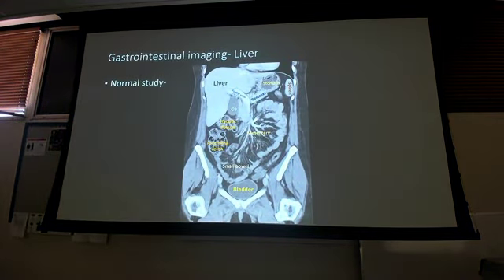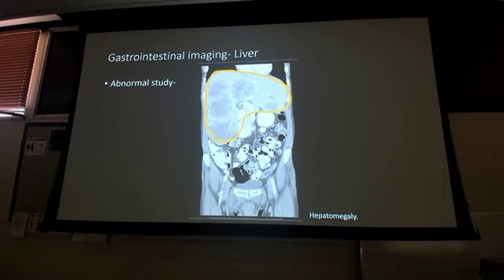Normal study, this is your CT. I also got it labeled for you. Know what normal looks like, so that way when you get this, you know it's not normal. What's wrong with this liver?